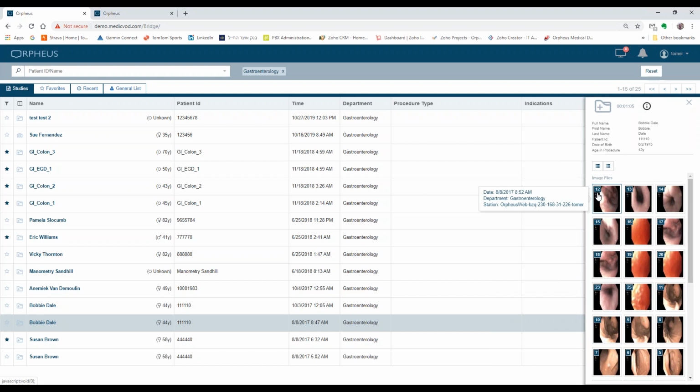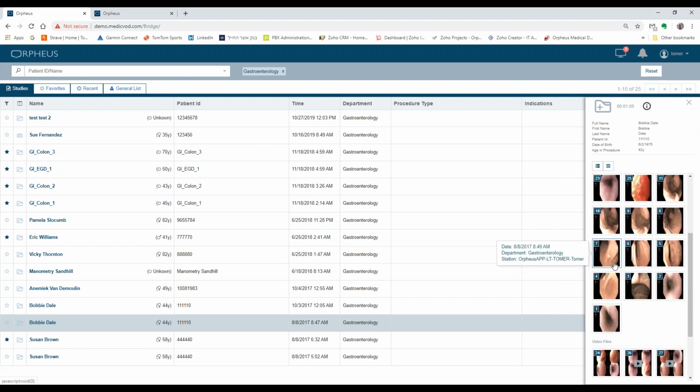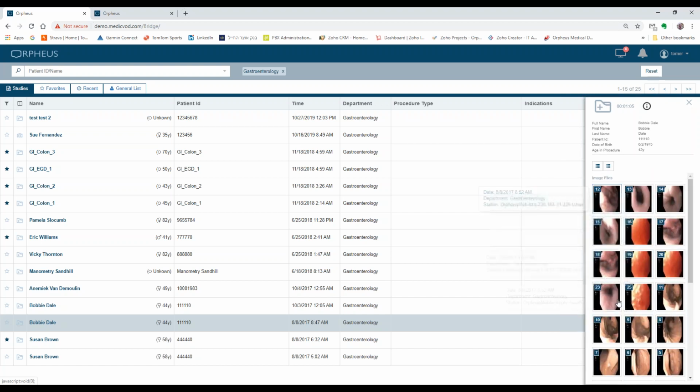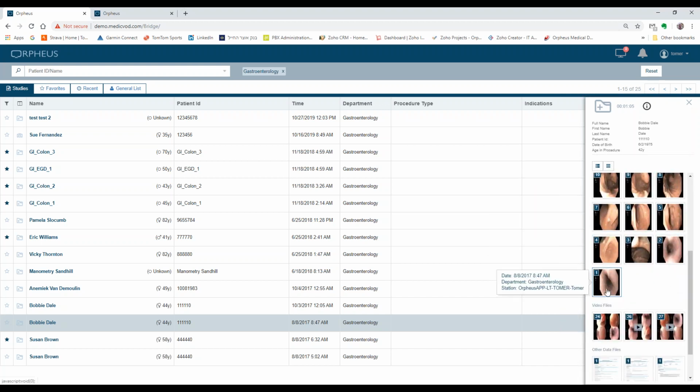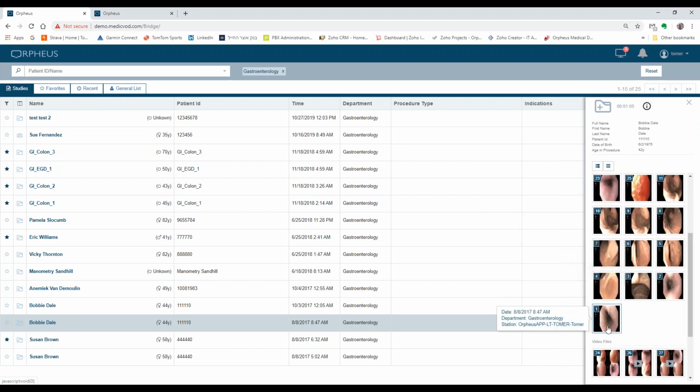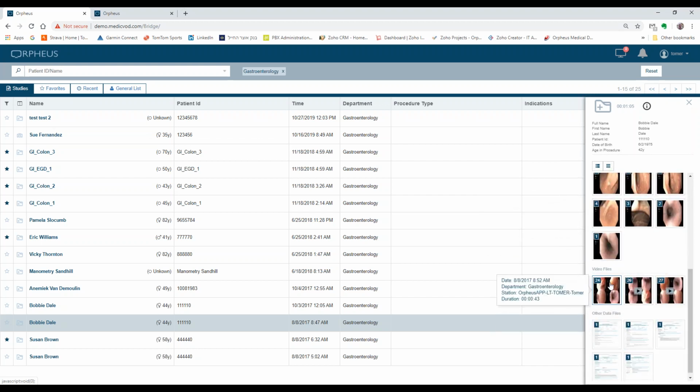And regarding the images and videos, you see here index numbers, 12, 13, 14, and so forth. They're running numbers. Of course, the first media file created on the CAS device will receive number 1, and they will then have a sequential number. And you can see here that they're sorted. Typically, they're sorted latest on top or to the left, and the earliest last. And also in regards to video files.